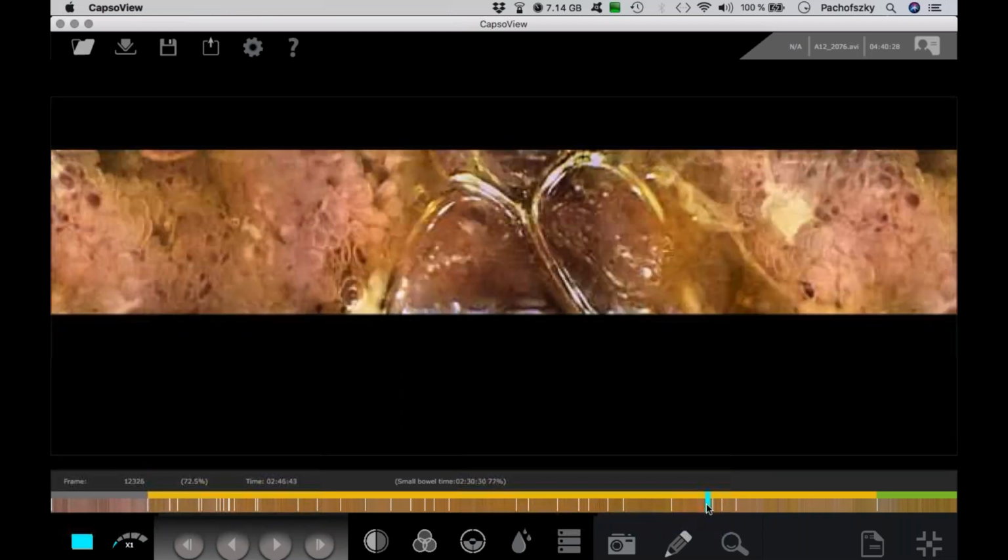in the distal part, because there's now a dramatic change. What we can see, there are also some ulcers. Here a really big ulcer in this area, but it will become much better.